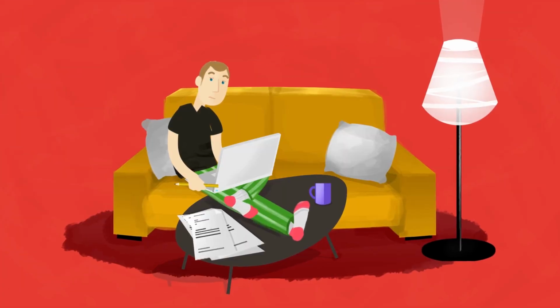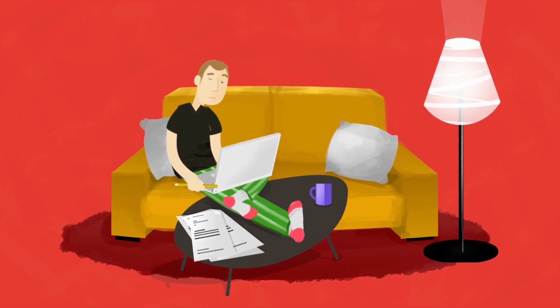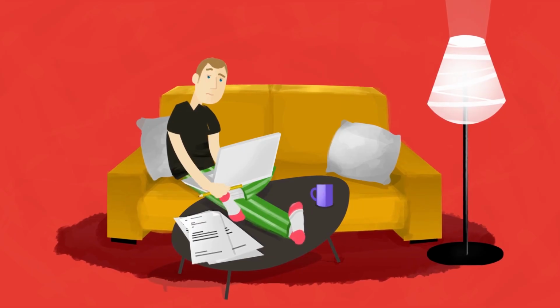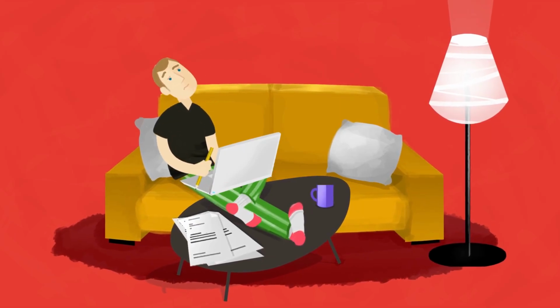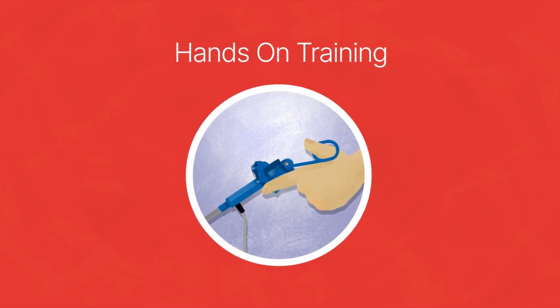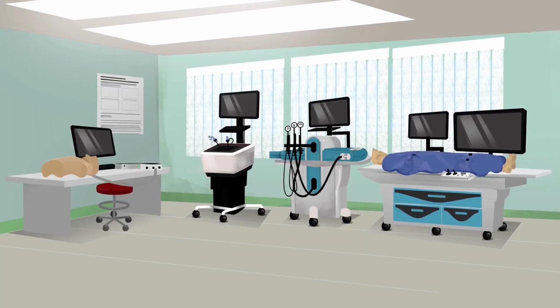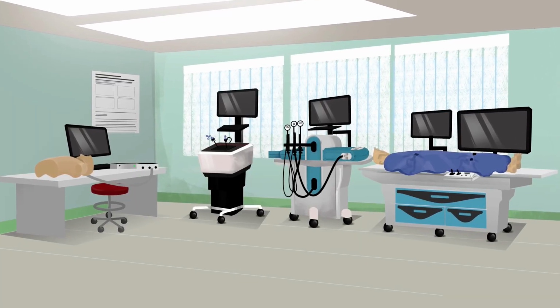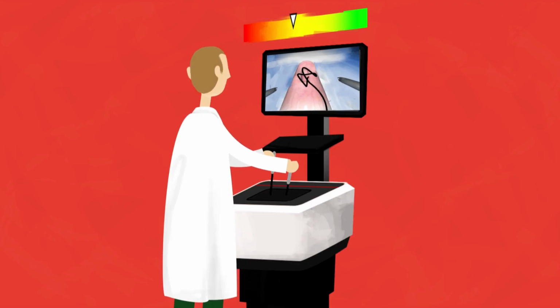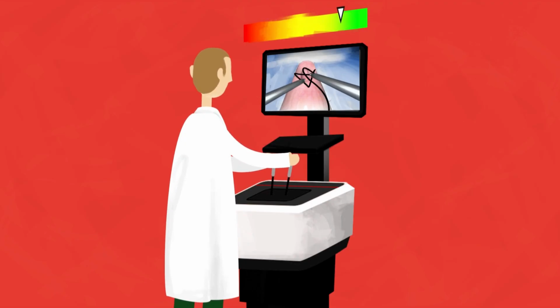Julie and Paul are required to acquire knowledge prior to simulator training. They have access to learning material online 24/7. The residents arrive at the training center prepared for hands-on training. Residents are expected to reach the predefined benchmark levels before participating in procedures in the actual operating room.